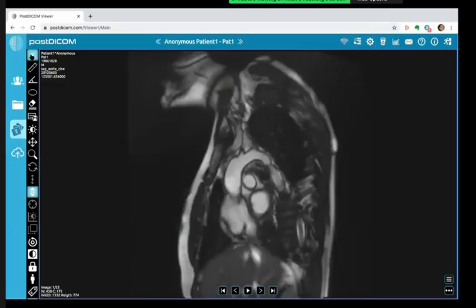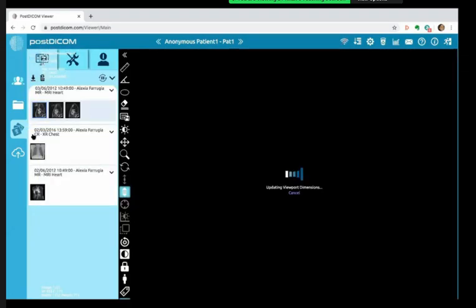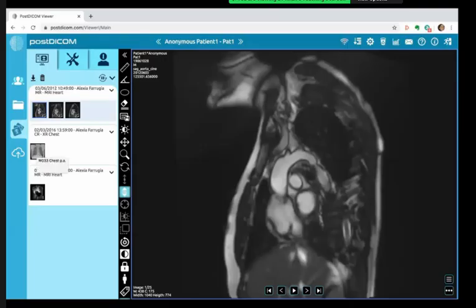The patient would need blood pressure measurement in the left and right arm and upper and lower extremity distribution as well, to check whether there is a discrepancy in the blood pressure. Ideally, since it's a young patient, that's probably why we went for MRI and not for CT angiogram. Yes, but this is quite suggestive of a coarctation of the aorta.